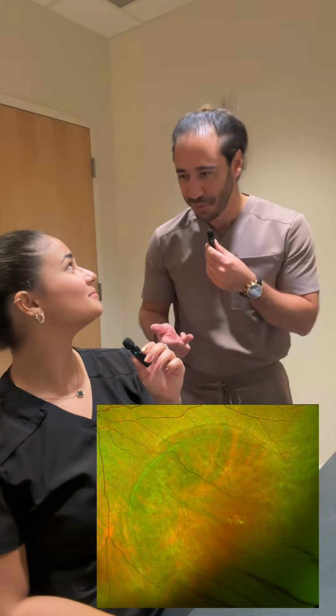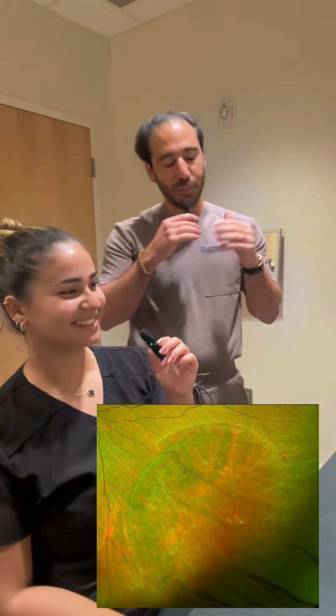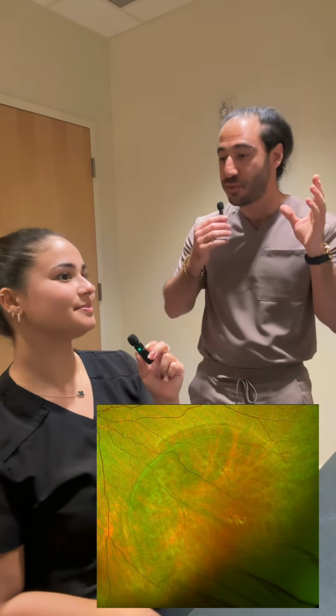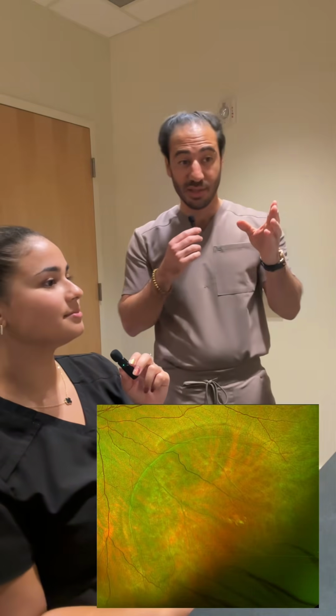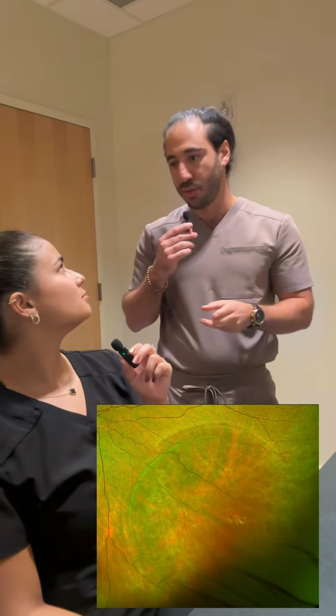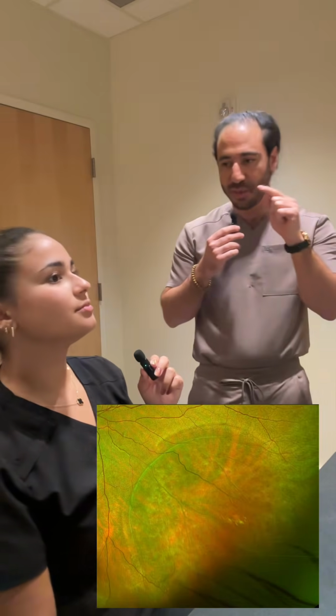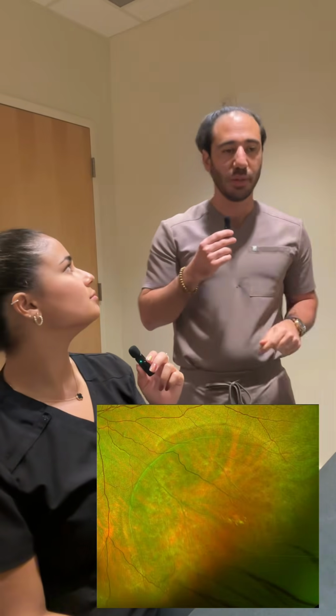Do you know what condition we're looking at? Retinoschisis. Okay, that's retinoschisis. So what separates retinoschisis from retinal detachment? That's the big one. You'll be surprised to know that some doctors would send that to the ER saying, hey, this patient has a retinal detachment. So here are all the things that will confirm that it's schisis versus detachment.